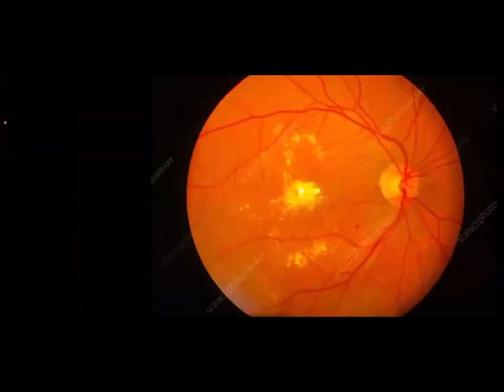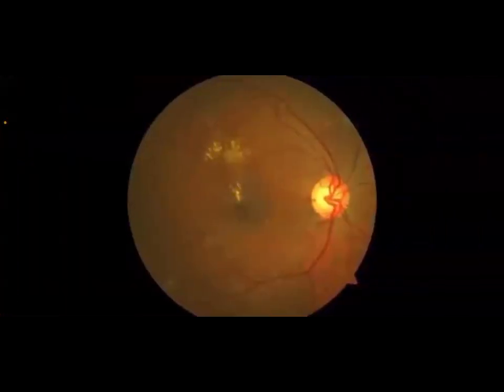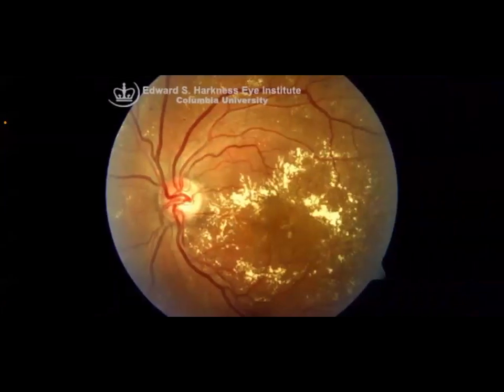Okay, this is again maculopathy, and this is also a mild degree of maculopathy. Here there is possible optic atrophy also, by the way. And here extensive yellow exudates scattered throughout the retina and affecting only the upper medial side of the macula. Okay, so there is maculopathy.